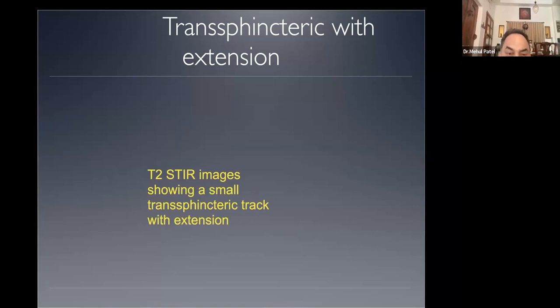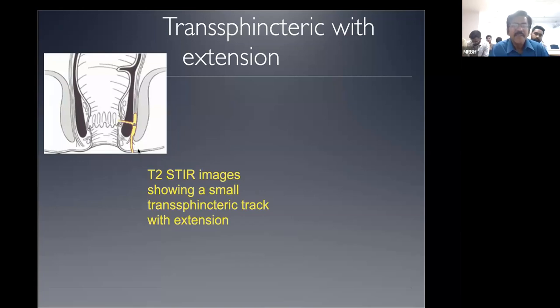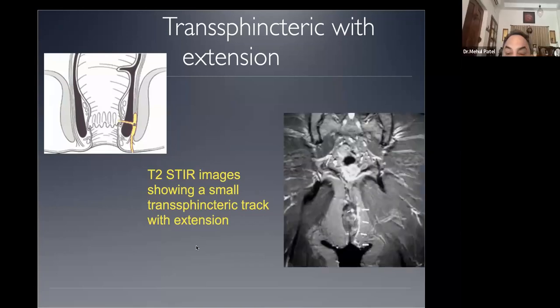Now, this is a transsphincteric, right? So it is going in. No, this is not a transsphincteric. This is still an intersphincteric. Sorry, apologies. On the other hand, this picture is a transsphincteric. So these two pictures don't tally. This picture should have been coming from here and going like this.